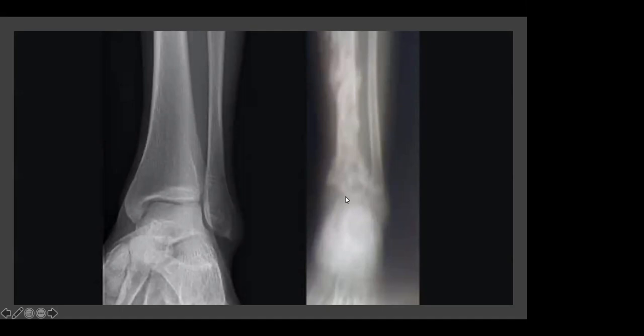It's completely obliterated here. And we've got examples of regional osteopenia, which is exactly what you think it is, where there's a darker area here and here, where there's been osteopenic changes. And we've also got periosteal reaction, which is represented by this fuzzy appearance of the cortex of the bone.